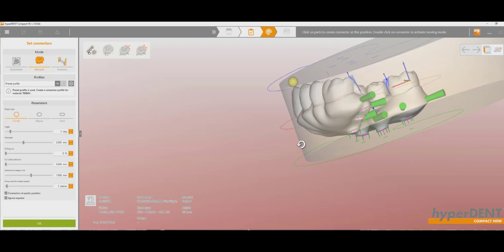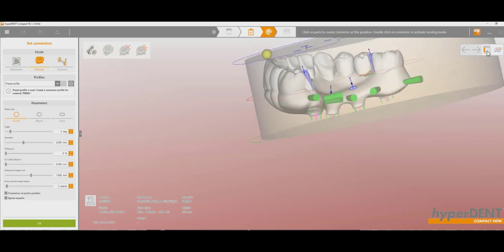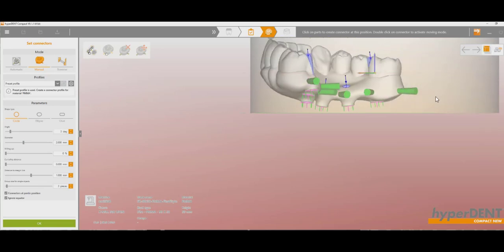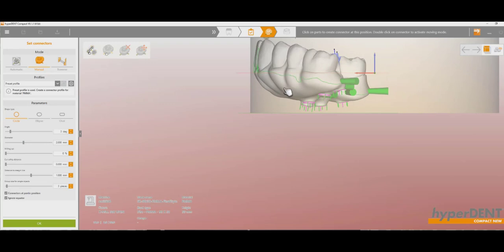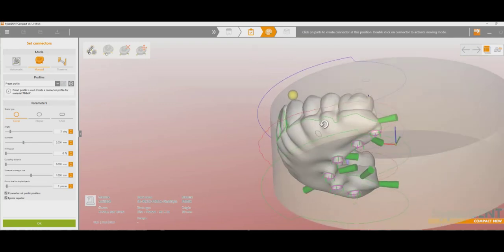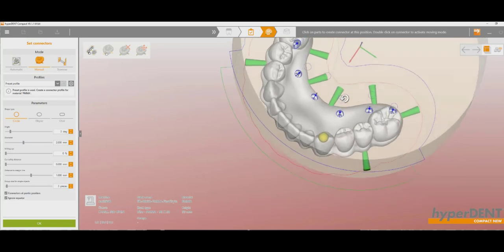You can also use your face select, if that's what you call them. I guess you have to be familiar with it, it's more the face of the disc than the face of your teeth. So I'm going to hold Control, move it around, and then select this. Alright, so I feel good about that.